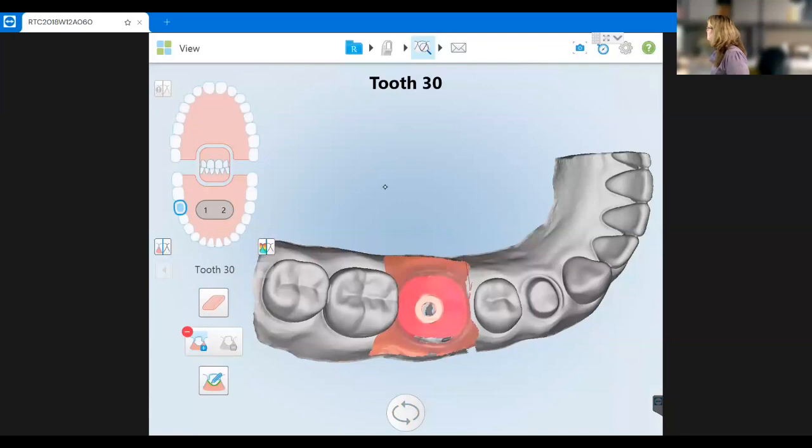Actually going to add even a little bit more so that the tissue is completely encircled in the digital dye. Now, oppositely, if you wanted to erase it, you could do the same thing, right? And I'm just going to over exaggerate here so that you can see what I'm doing. Right? See how that removes? Or you could add it back in place.